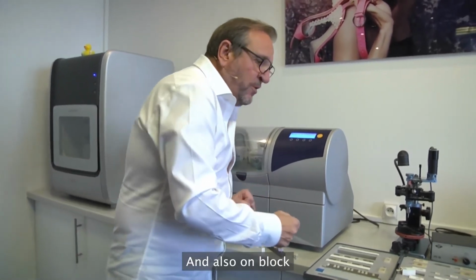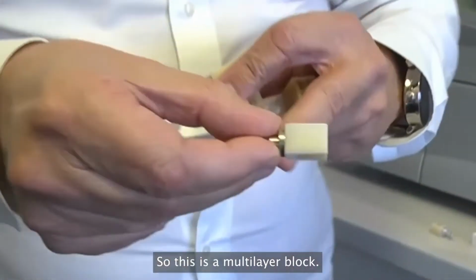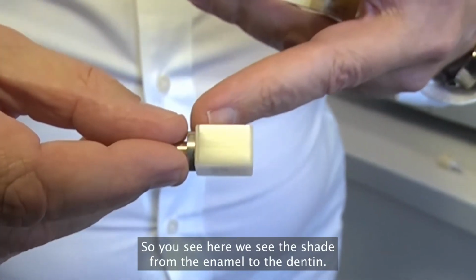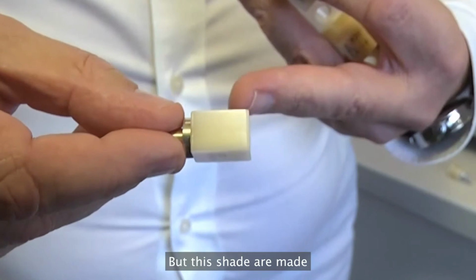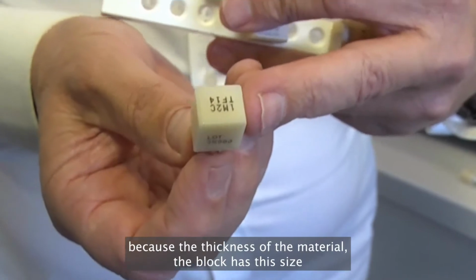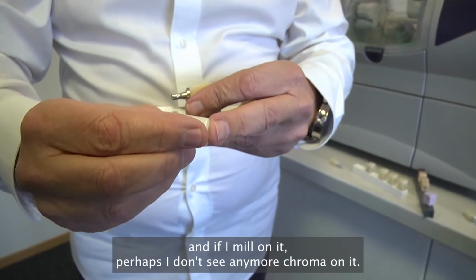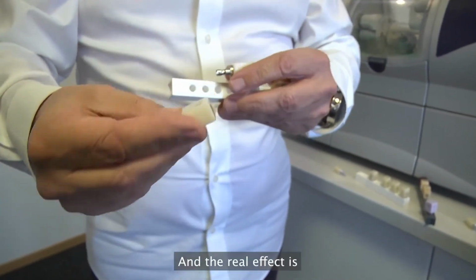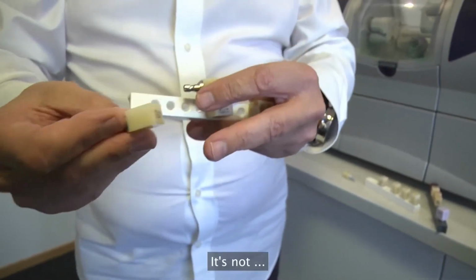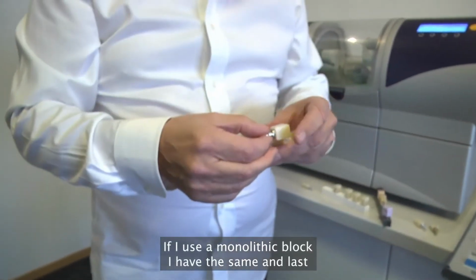And also in blocks, we have the possibility to have a multi-layer block. So this is a multi-layer block. You see here, we see the shade from the enamel to the dentin. But these shades are made because of the thickness of the block, which has this size. And if I mill it, perhaps I don't see any more chroma on it. The real effect is that I don't need multi-layer for that case. There's no sense, in fact. If I use a monolithic block, I have the same.